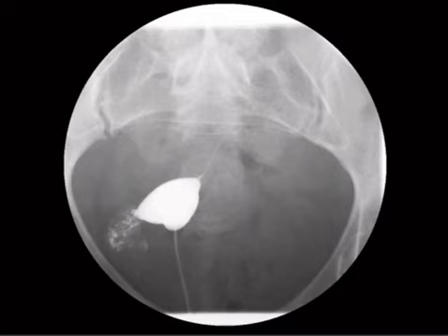But I think that uterine malformations are more likely to be shown in MR, as it is the quote test of the future. But they can certainly show them in a 3D ultrasound or in the traditional modality here. I think that this is more likely to show either this entity or Asherman's syndrome, which would be a bunch of filling defects within the uterine cavity itself.